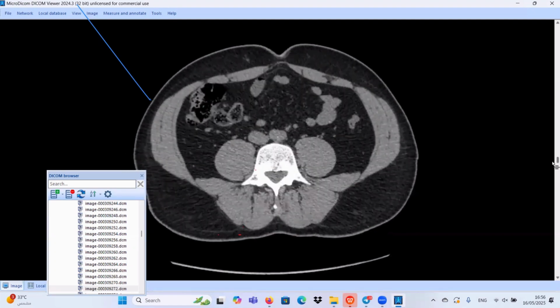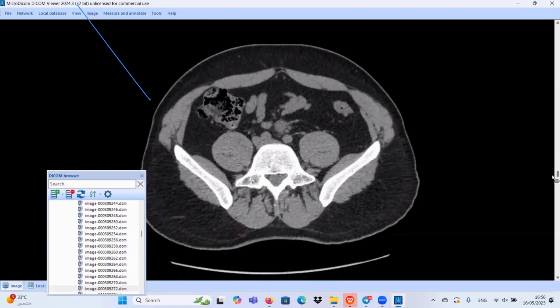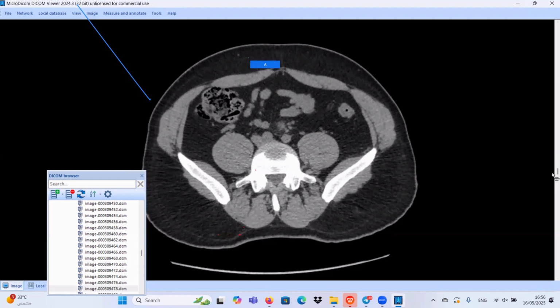And this is the aorta and both anterior. Yeah, I feel that there is abnormality in the mesentery surrounding the bifurcation of the aorta. This area is not clear for me yet. So in your checklist, you should check for any other abnormalities in the mesentery, and you found rounded soft tissue density along the inferior mesenteric vessels. You are right. Yes.